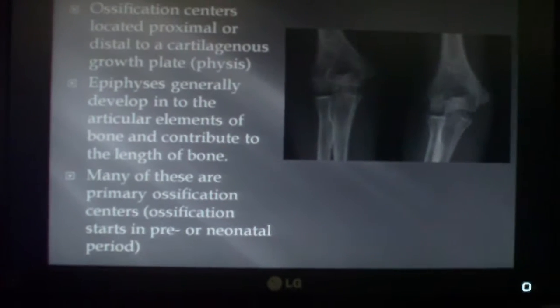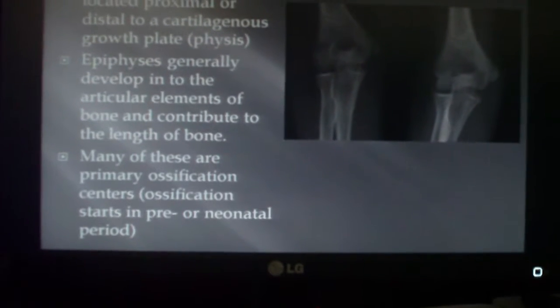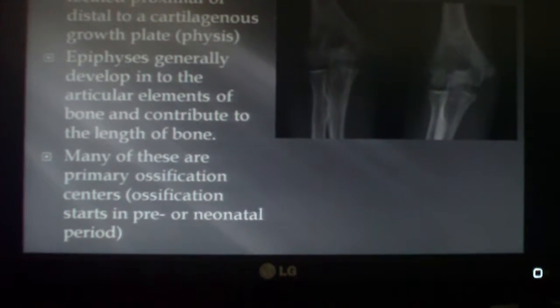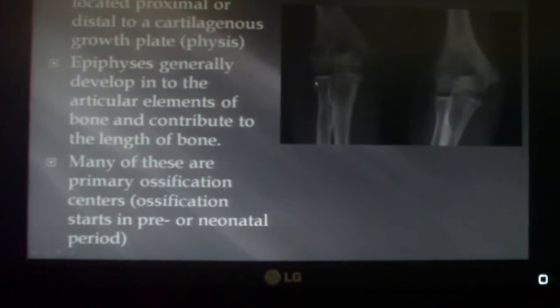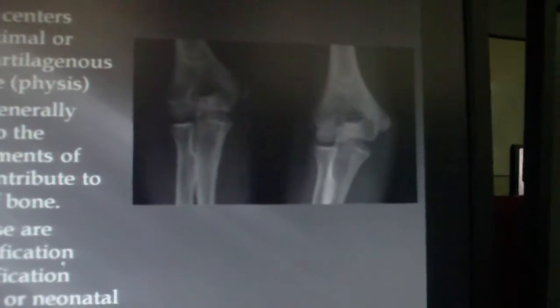This again is for the attachment of ligaments and tendons, and oftentimes will be responsible for growth in width, right? Whereas the epiphysis is more for growth in length, right? There could be any growing going on. So here we've got an epiphysis, right? An apophysis here, medial epicondyle.